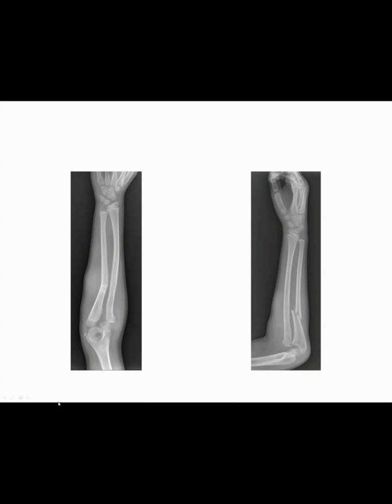So let's apply our approach to the forearm radiographs that we were provided. When we're assessing for alignment, the first thing that catches my eye is that the radial head is not articulating properly with this capitellum. And on the lateral radiograph, if we draw our anterior humeral line, we notice that it's not intersecting with the capitellum at all. And the same thing when we trace the radiocapitellar line. There is no intersection. So what this is suggestive of is radial head dislocation.